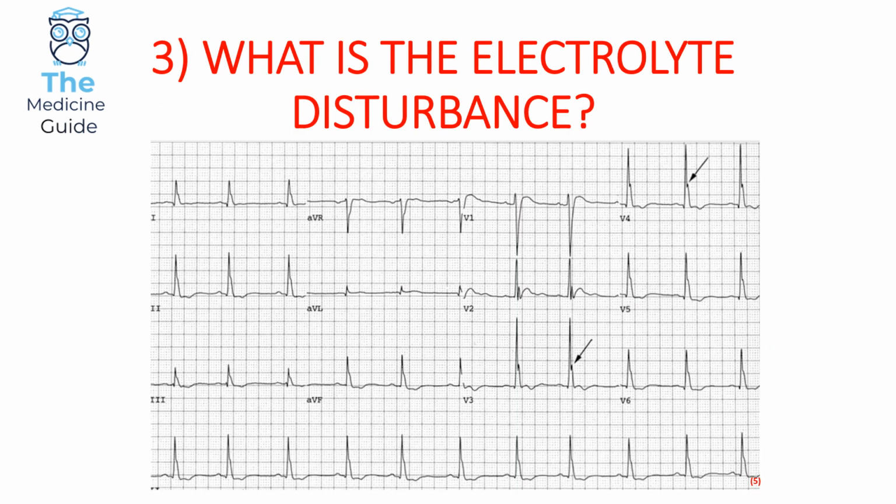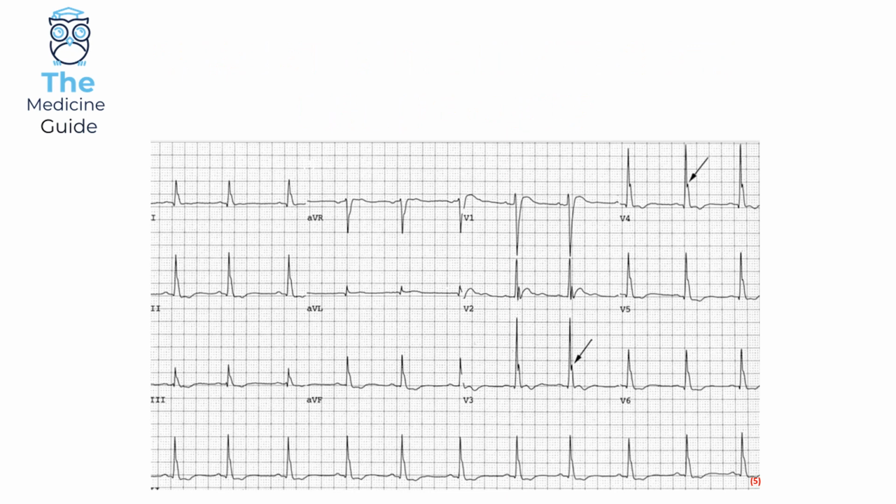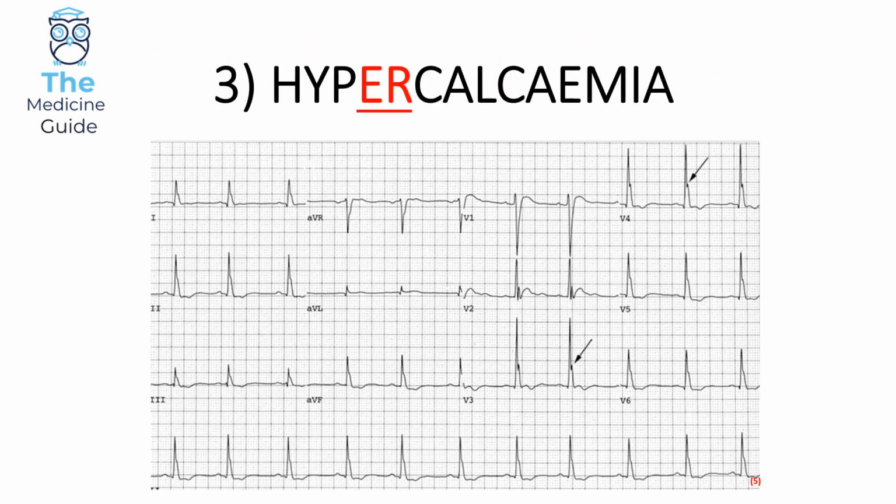Okay, so our third ECG. So again, I'll give you 20 seconds, or you can choose to pause the video. Now this one's a little bit more difficult, I think. Okay, so let's look at the answer. So this is an example of hypercalcemia. Now this one's quite tricky, I thought.